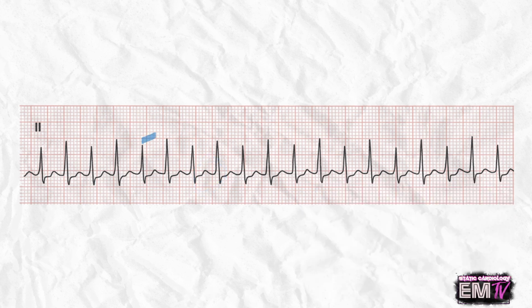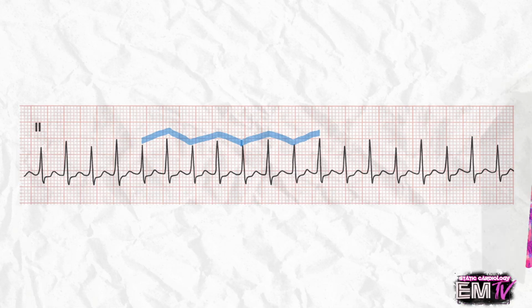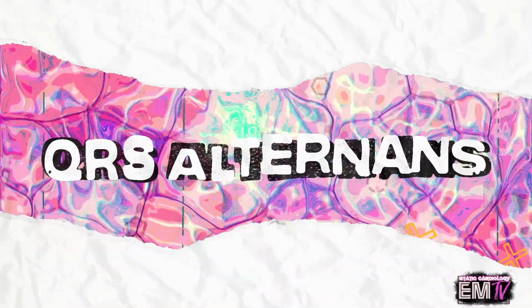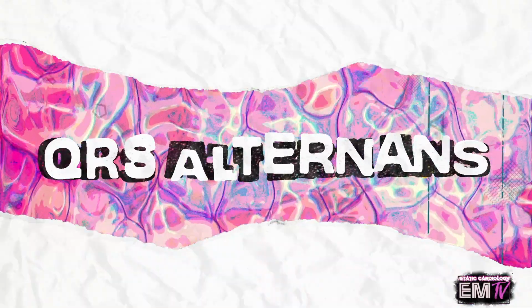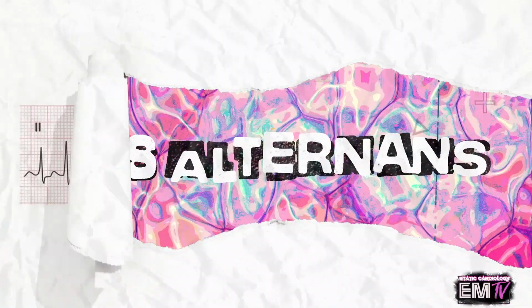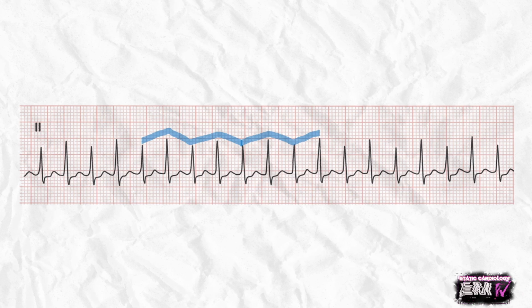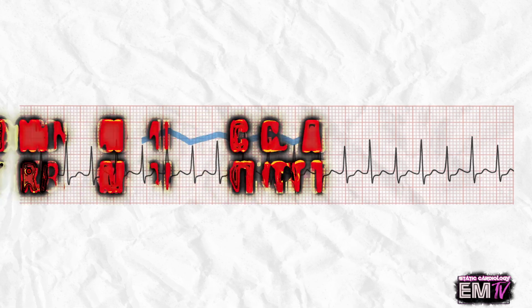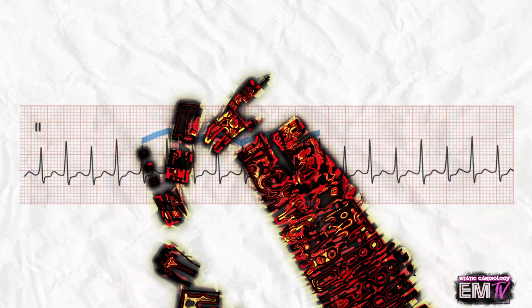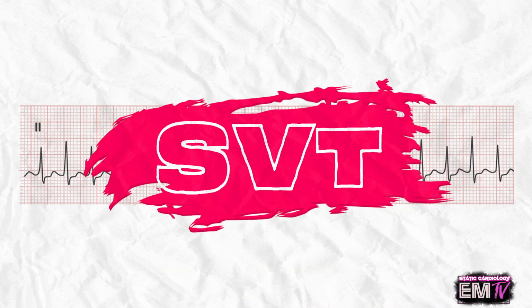The last thing you may have noticed here is the alternating height of the QRS complexes. This phenomenon is known as QRS alternans. QRS alternans is often associated with individuals suffering from an acute pericardial effusion or a cardiac tamponade. But because the information in the scenario does not mention any sort of chest trauma or significant underlying history, this may not be the cause. QRS alternans can also be seen in patients suffering from orthodromic atrioventricular reentrant tachycardias, which are considered a form of SVT.